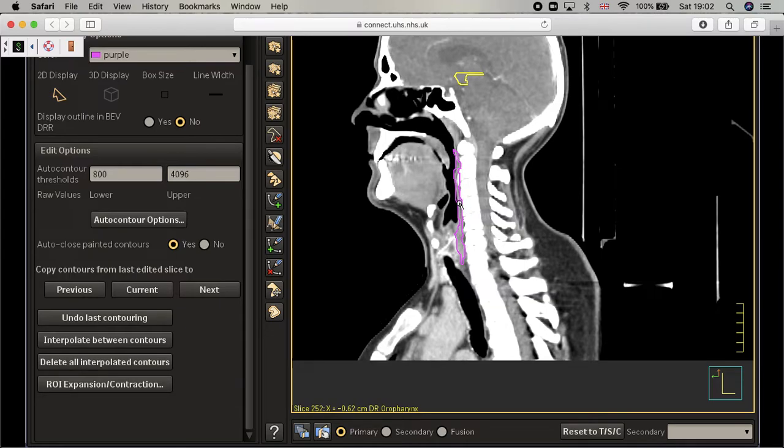The inferior constrictor, as I said, you can start at C3 or just as continuity, and some people would start it at the lower border of the hyoid bone, and that's why the differences between the guidelines make us very confused. So some would start the inferior constrictor at the hyoid, but honestly, if the position of the head is different, I think it will be very, very low. So I wouldn't. It's just a suggestion from my side.